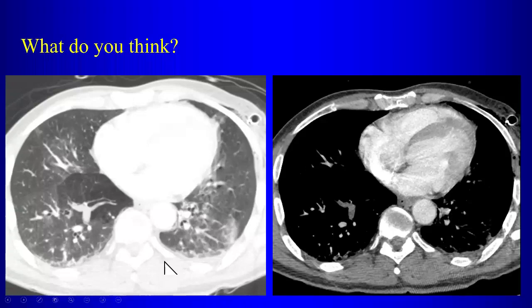How quickly we forget. So what is this? Well, allergic bronchopulmonary aspergillosis can give you mucoid impaction, right? It can be associated with air trapping, but usually when you have such pronounced air trapping around an area of mucoid impaction, we think of something else. What do we think of?